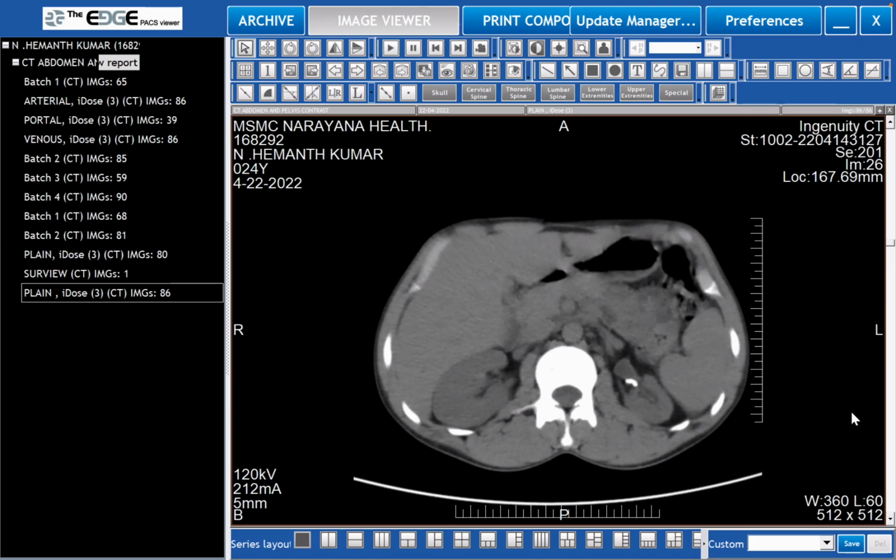In this film, any uneven texture of the cortex. In this film, we CT scan. I mean, you can see it quite nicely. Lots of things. Yes, sir, but in this film we can't see the perinephric stranding. See the film. Yeah, sir. Shubham, negative findings which are important have to be specified. And Shubham, suppose I said that in this cut I can see scars. Would you agree with me?